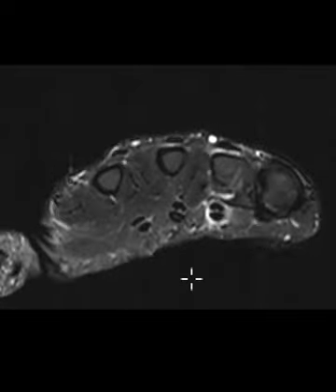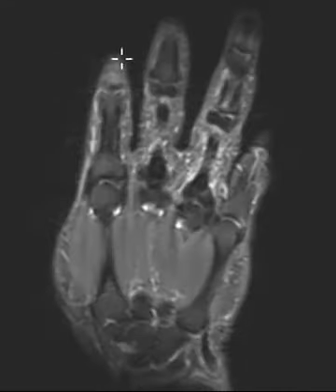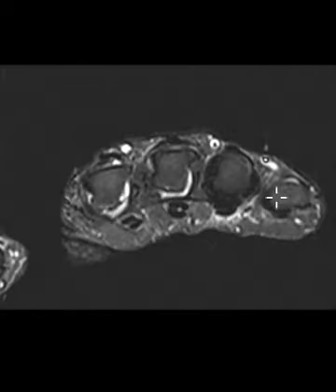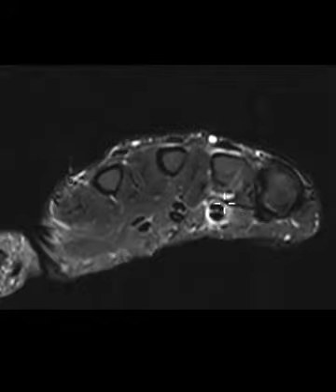We can see this on another view. This is called a coronal STIR view. We can see all the fingers here at the same time. If I zoom back, this is the second, third, fourth, fifth digits. And on this view, we can see the halo of inflammation. That flexor tendon sheath is thickened, inflamed, edematous on that view. So the trigger finger, or stenosing tenosynovitis, is what we call this. And again, this is inflammation of that tendon sheath that restricts or constricts the flexor tendons.